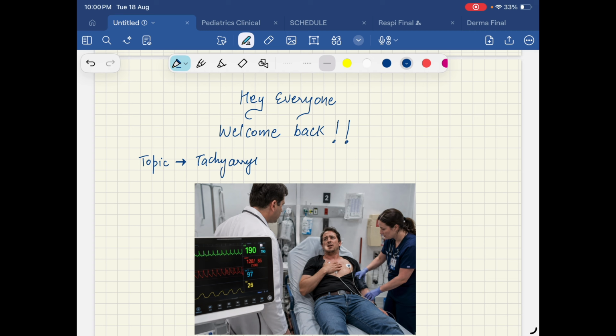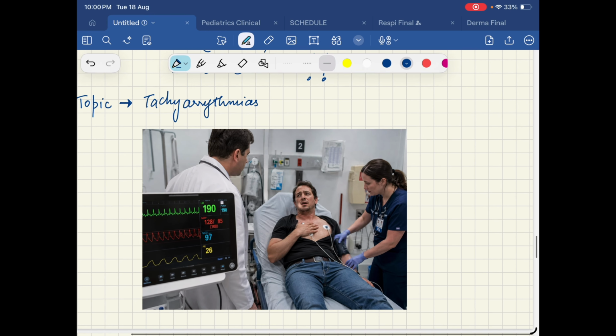So today we will be discussing a new topic, which is tachyarrhythmias. In this video you will be able to know what tachyarrhythmias are and what different kinds of ECGs you'll encounter. So let's start with a very good case scenario.